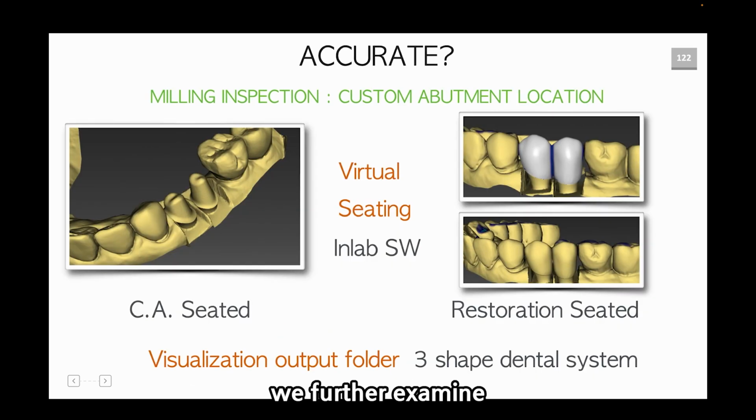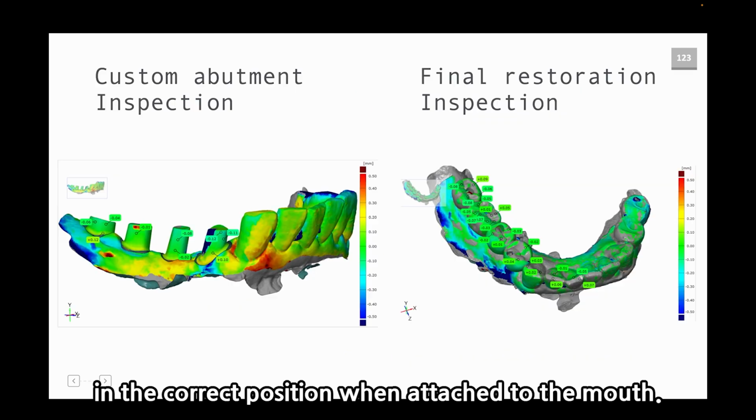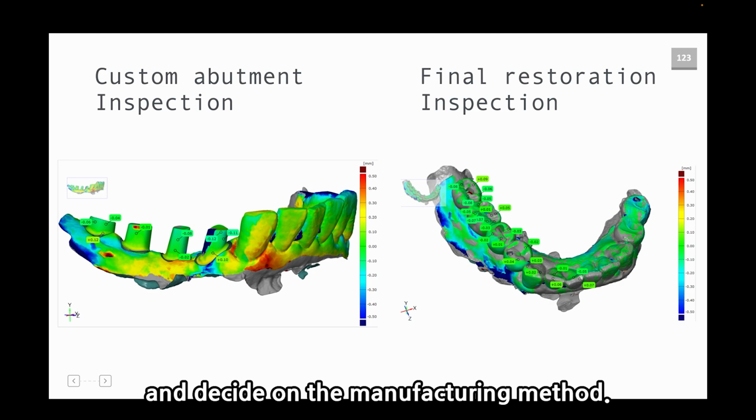We further examined whether these custom abutments and restorations are in the correct position when attached to the mouth. Through this analysis process, we can identify where errors occur and decide on the manufacturing method.